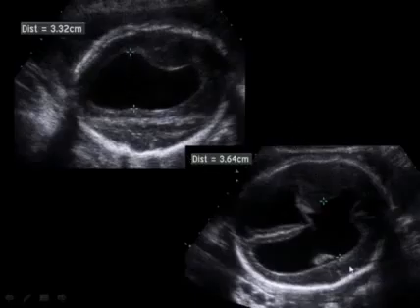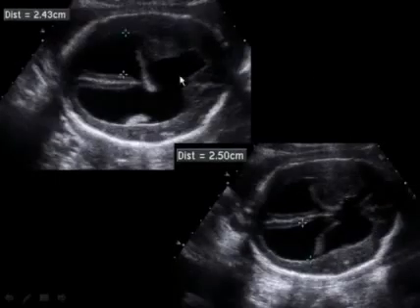Here's the same fetus in the down ventricle, and we have also artificially increased the size of the ventricle to 36 millimeters because we've crossed the midline, and this is at least part of the third ventricle and possibly part of the up ventricle that's being measured as well. More accurate measurements for this fetus: the falx is right down in the midline, and we're back in the atrium, and we have a measurement of 24 millimeters. And on the downside, again, here's the dangling choroid, the medial aspect of the ventricle and the lateral aspect of the ventricle, 25 millimeters. Why is this important?